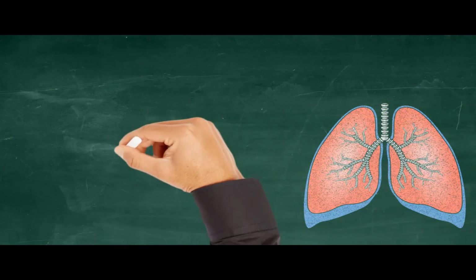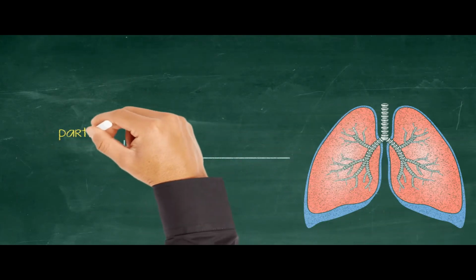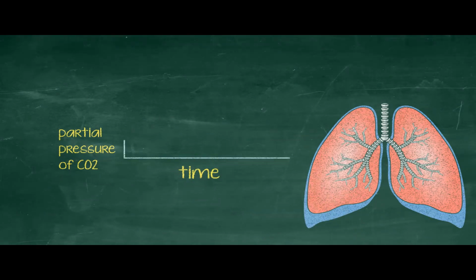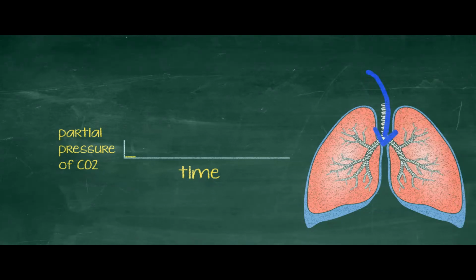Capnographic waveforms are normally displayed on a graph with the partial pressure of CO2 on the y-axis and time on the x-axis. A normal baseline on this graph is 0. The baseline occurs when the patient pauses between breaths or is inhaling, and it's indicative of a very low, nearly 0, partial pressure because it is the CO2 in the atmospheric air that is being sampled during these intervals.